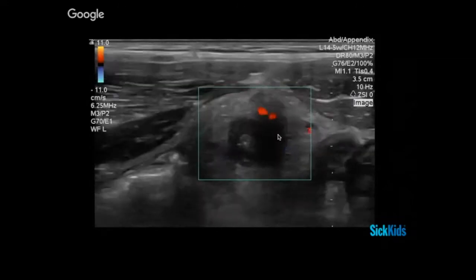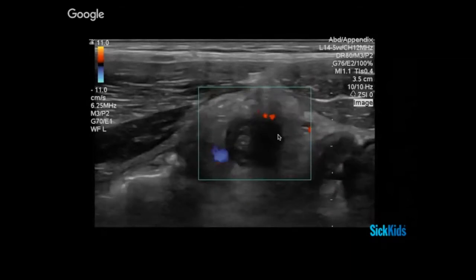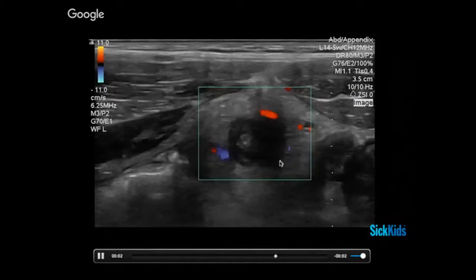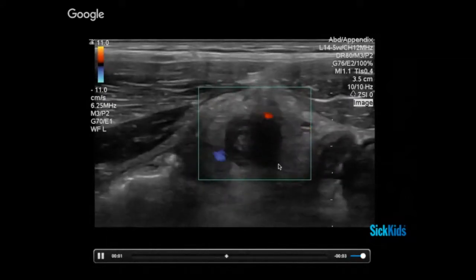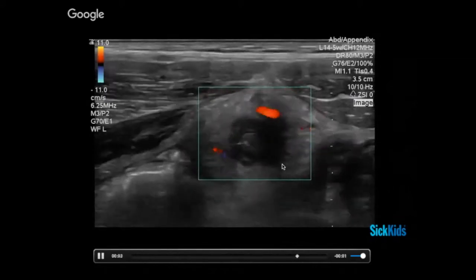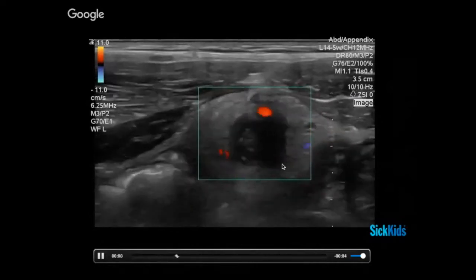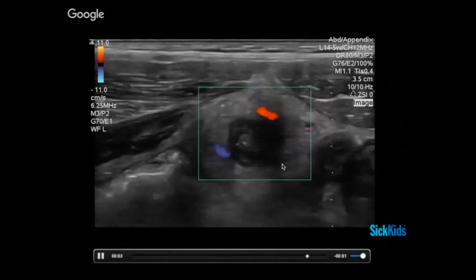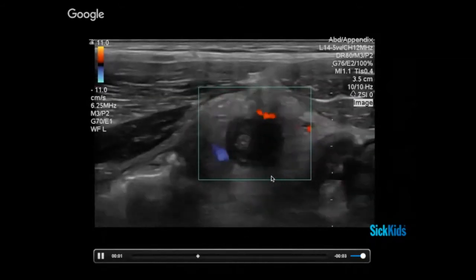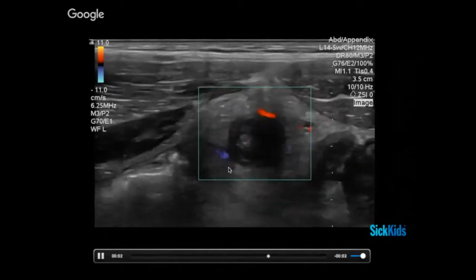Okay, I've got thickened mesenteric fat, wall hyperemia. What was the other one? It's something that looks like a circular bowel area within. I'm not big on wall hyperemia, and I'm not sure the primary literature really bears out the fact that it plays that much role in making decisions. But it's something you're going to see in reports and you're going to hear about, so we'll talk about it. For me, nothing in this image is more powerful than that thickened fat lying around the appendix.